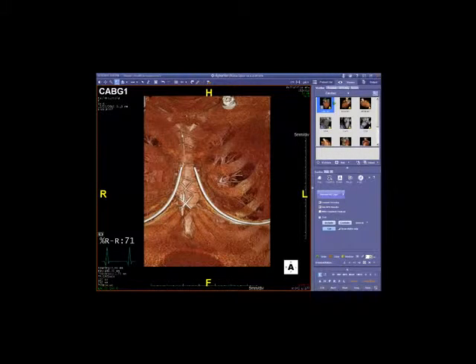And in this patient, cardiac CT angiography was done to look at the patency of her newly placed bypass grafts. And I think you'll find that this particular technique is very well suited to looking at graft patency, and it's very quickly and easily determined whether there's a problem with the grafts. It's very rare to have early graft failure, and that's why CT may be preferable to just going straight back to the cath lab again.